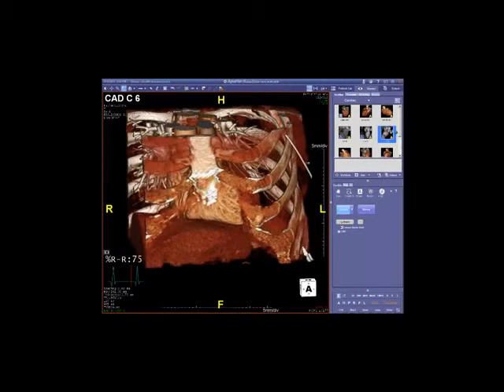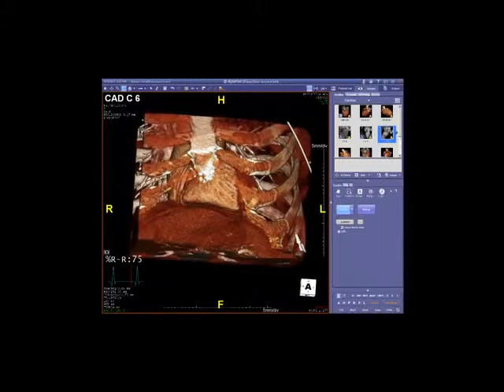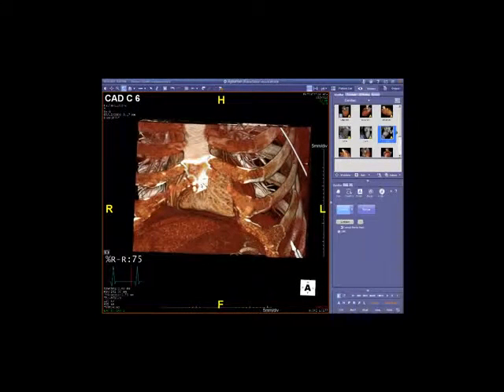And he presents to the emergency department, a smoker with a family history of heart disease, but came in with some atypical left lateral wall chest pain. His cardiac enzymes were unremarkable and his EKG was negative, and he was in the decision tree as to whether to admit the patient or to discharge him for outpatient follow-up. The decision was made to perform cardiac CT angiography in the emergency room, and this is his study that was done in the ER.